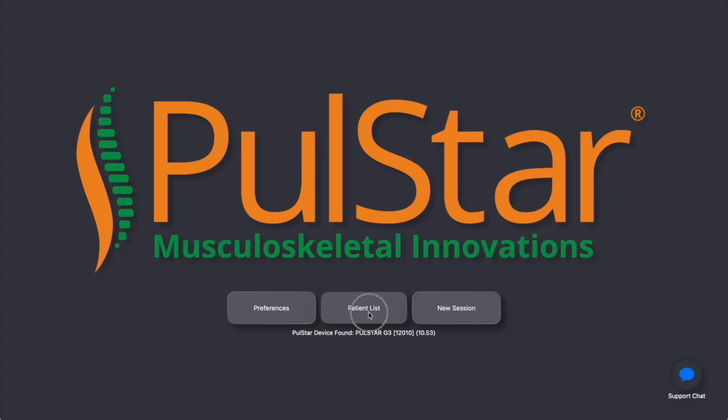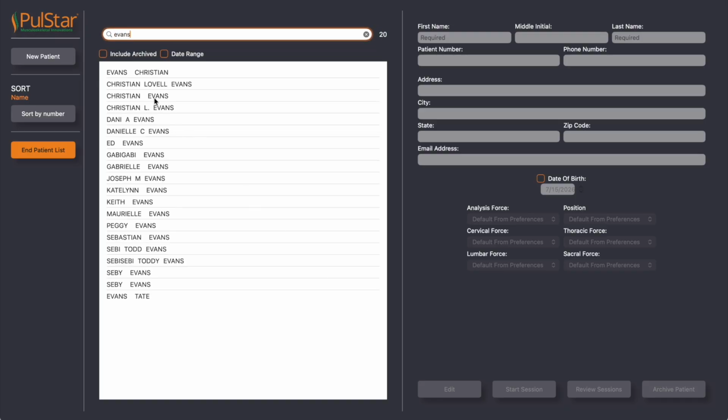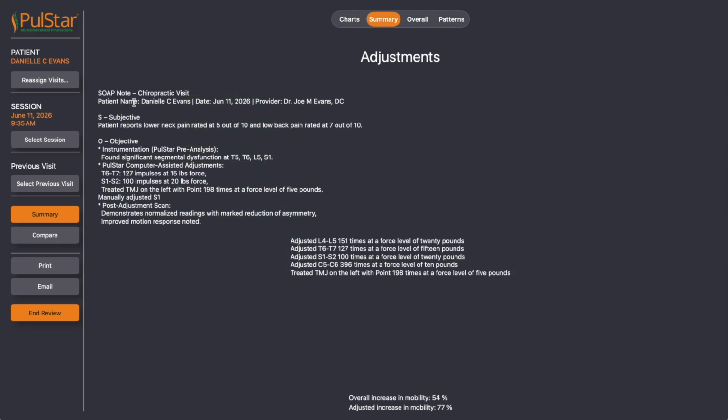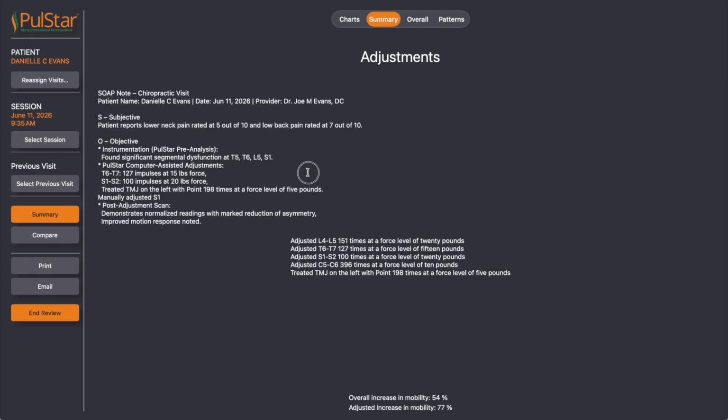First up, if I bring up my wife's patient file, you can now copy and paste directly from the notes section. So we can actually just Control A, then copy all this information, and then you can pull those findings into a report, a referral letter, or another patient's chart in seconds without having to retype a single word.